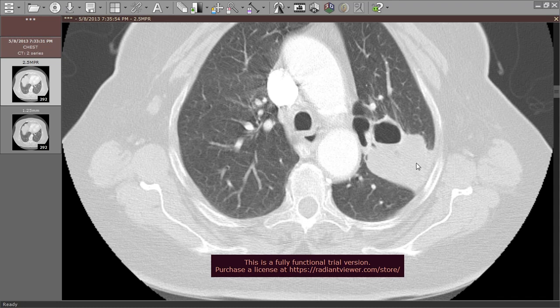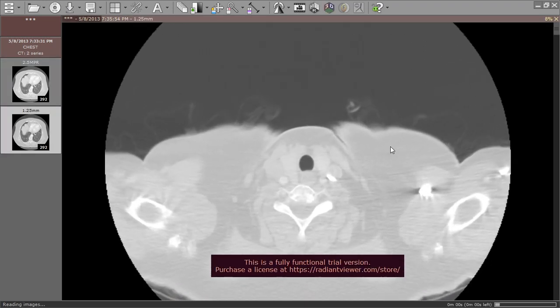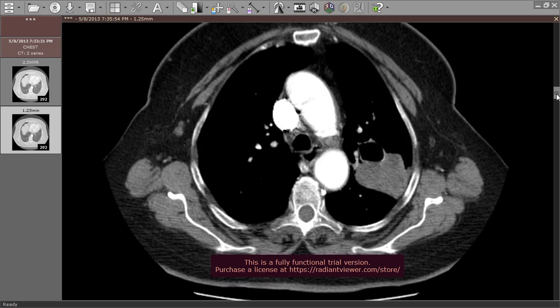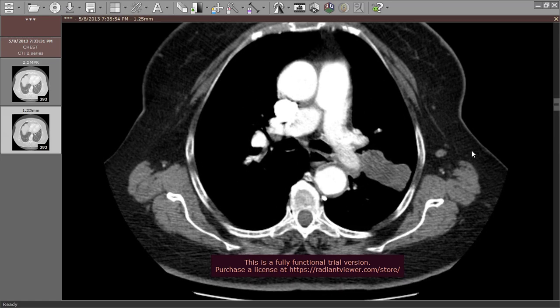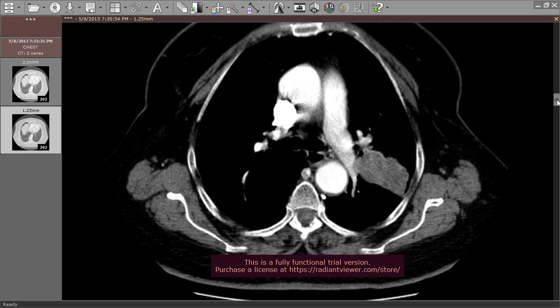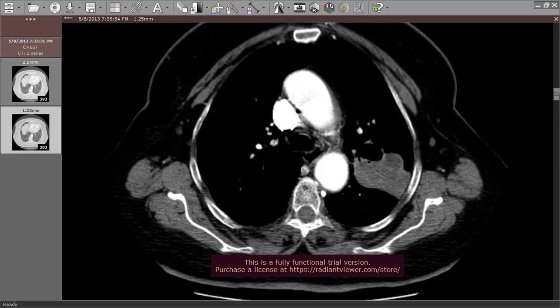What about this pathology? You may misdiagnose this as a mass at first, but if you notice very well, it attains a tubular configuration, a parallel tubular configuration with hypoattenuated material inside it. So it is actually a dilated bronchial wall, but with retained hypoattenuated material or mucus fluid. This is typical of what's called mucus plugging.